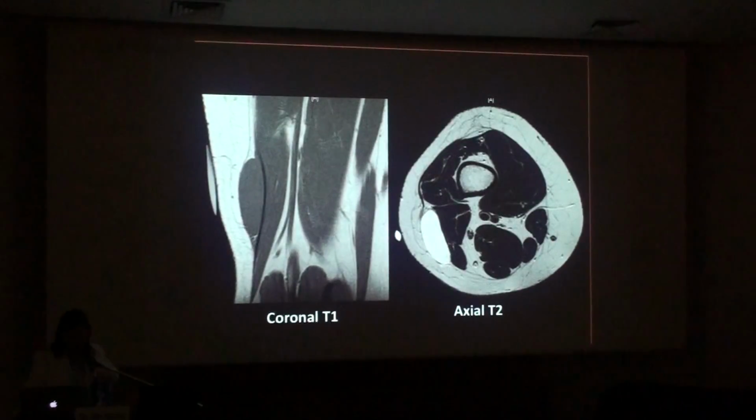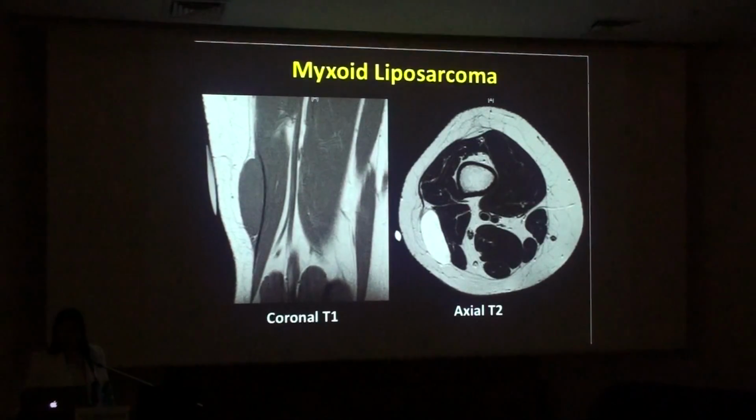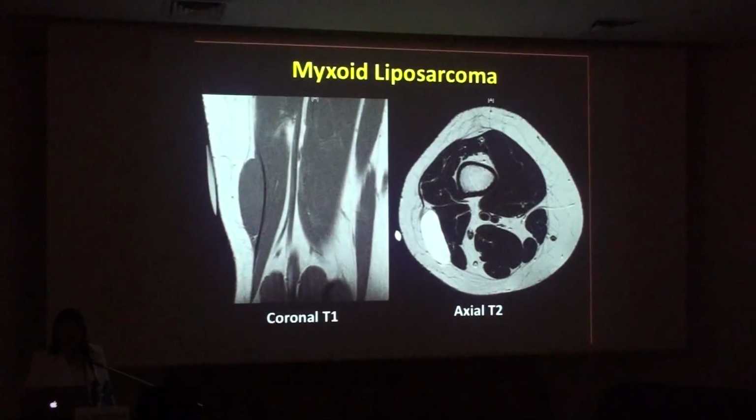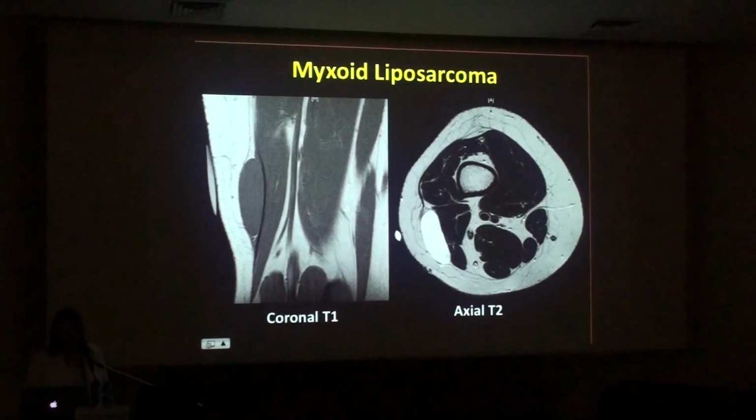All right, so what about this? We're in the distal thigh, we're posterior. Here is the lesion. This is actually the marker, so this was a palpable abnormality, pretty isointense to muscle with a little bit of a mass effect. Axial image through the same lesion right here, hyperintense on T2, maybe a little subtle internal signal, but really pretty bright. The surface of it is smooth, but actually this was a myxoid liposarcoma. So this was a pretty bad actor.